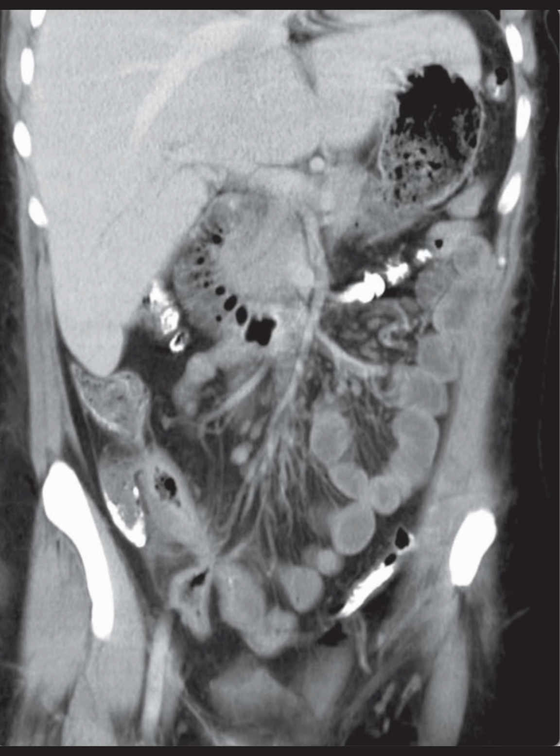Gastrointestinal tract fistulation comes in various forms, with the most common being enteroenteric fistulas caused by Crohn's disease. However, any adjacent luminal structures can potentially form a fistula. If Crohn's isn't the underlying issue, other chronic inflammatory diseases or even malignancies might be the cause.